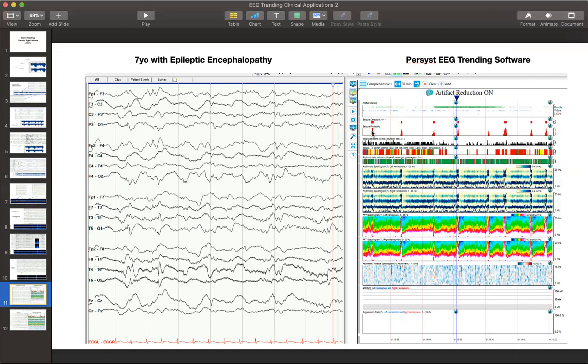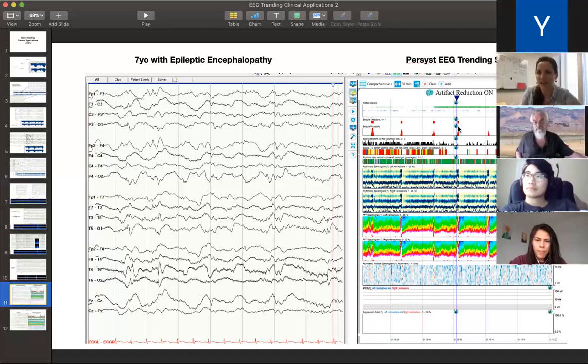But it'll also tell you the seizure probability and tell you if it thinks it's actually detected a seizure. So you could come along and count these as well. You can see that here's a seizure that's pretty consistent on the CSA, but it didn't reach the threshold. So it's not perfectly sensitive or specific.